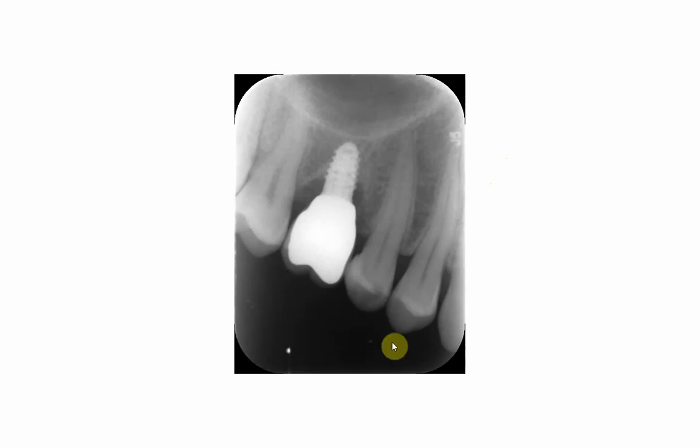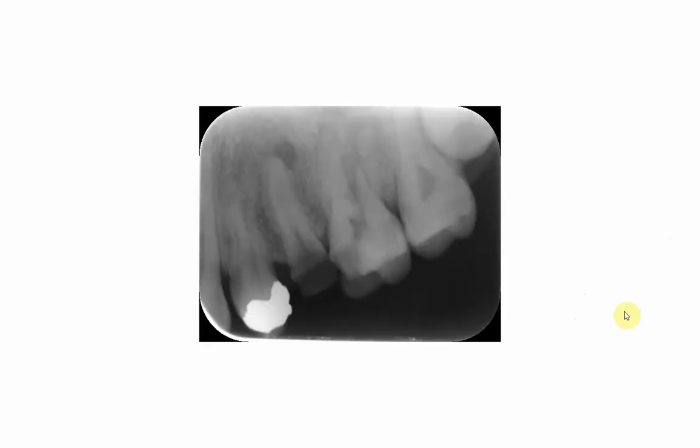So the film has gone down. Unfortunately, what happens sometimes, as if we go back to the video of the demonstration on the periapical angle bisecting technique, we will see that most of us will look at the anterior margin of the film and make sure that it is only 2 millimeters extending above the occlusal plane, and we forget to look at the other end of the film, and this is what happens. It goes down, it doesn't follow the curvature of the arch, and we will have a cutoff in the apices of teeth. The same problem is repeated in this radiograph, as you can see here.